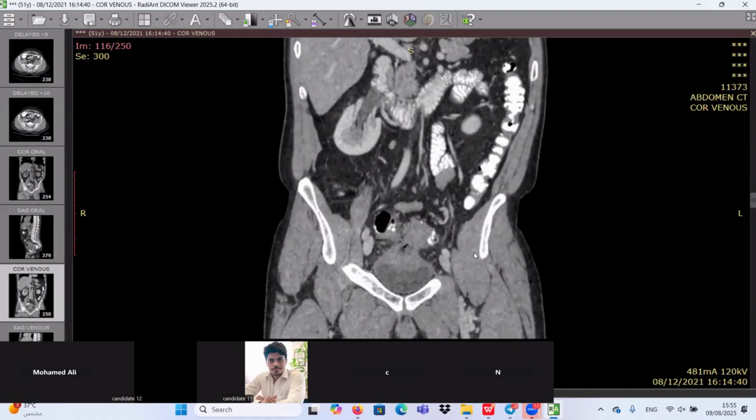Very nice. Long segment affection, and it is not obstructing the bowel loops. We have different diverticular outpouchings in the vicinity of this abnormality. We have a pericolic abscess formation and perforation. This is specific for diverticulitis. Fistula communication is also more common with diverticulitis.